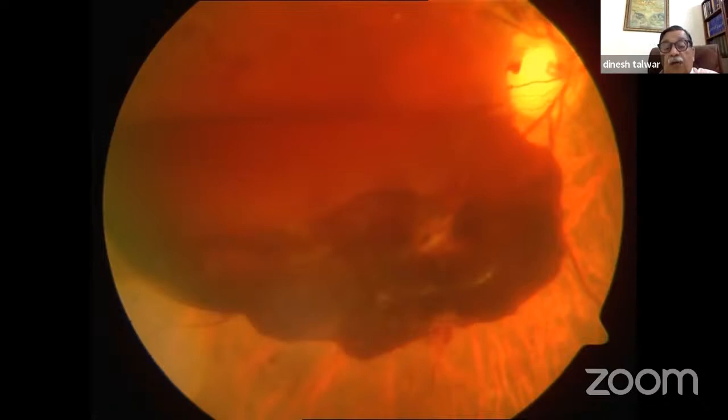You see this whitish thing coming? It is actually a thickened vitreous space, posterior vitreous space. And this is definitely liquid. Over here, there may be a part which is either a very thick hemorrhage, or there could be a clot formation in this part. That is why it's giving this appearance.